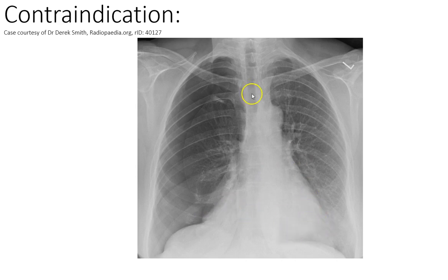Now the next thing I look at is lung markings all the way to the edge, and if you look at this bit here, and its similarity to this bit here, compared to this bit here. So the lung markings, I'm following them to the edge, and I come to here, and there's no lung markings beyond. So I can follow lung markings all the way to the edge here, and there's no lung markings beyond. So this is a pneumothorax.